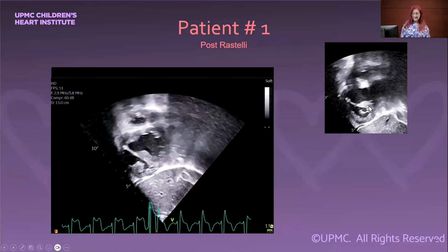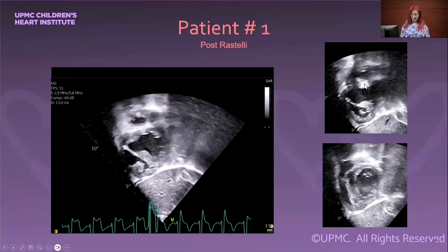You also can see that the septum would have lined up this way, vertically, right? So all of this volume was in the RV and is now on the LV side. Now, most of these patients have good-sized RVs because they've been having a systemic RV pressure for months. But I do think in this case, when we look at the RV, the cavity is smaller. It's still probably normal because the RV was so big to begin with.